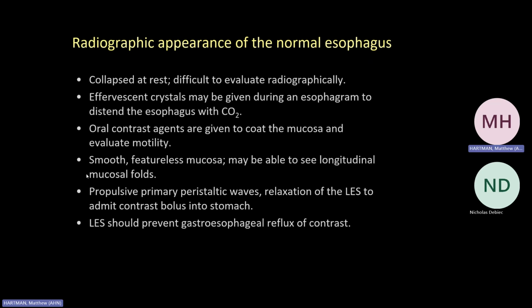A great advantage of fluoroscopy is we can study peristalsis. This is a big advantage we have in radiology over our endoscopic colleagues, who, when they do endoscopy, the patient's basically knocked out. But when we do this study, the patient is awake, we have them lying down, so gravity is out of the situation, and we can really see how the primary peristaltic wave is moving that food bolus. And it is also great for looking for reflux.